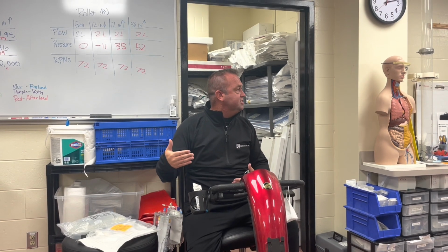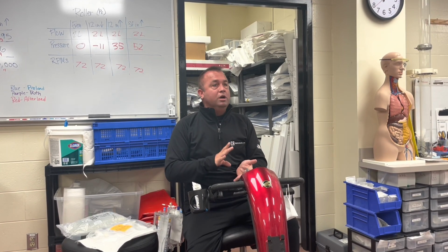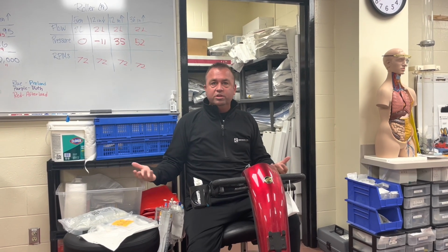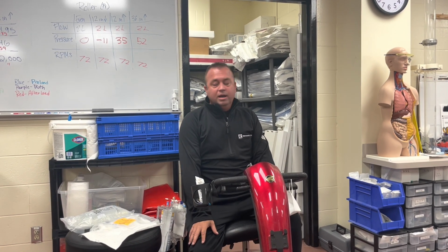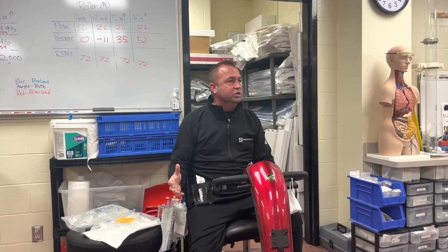And then we're going to progress this semester to where we use the setup that we do to measure pressures on different devices, ECMO, heart and lung machines, and off of vessels, eventually with pig labs, right? So the first thing we need to do is understand how pressure works.